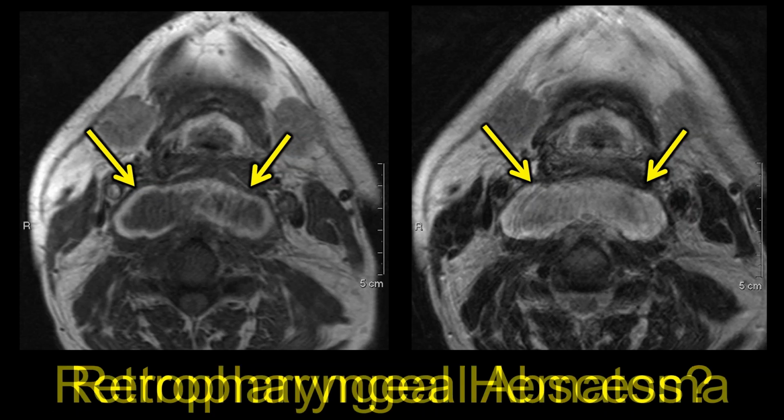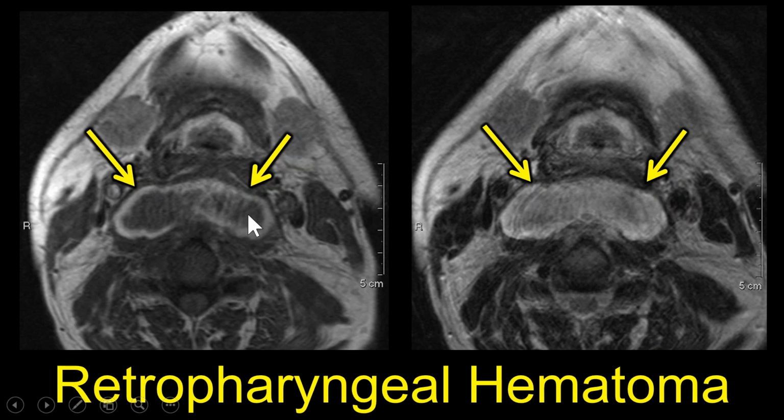That's going to make a big difference here. If this is before contrast, this could actually be just a hematoma. And this turned out to be a spontaneous retropharyngeal hematoma in this case at that site.